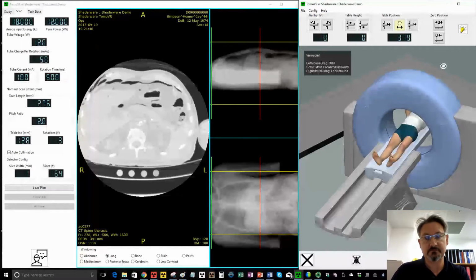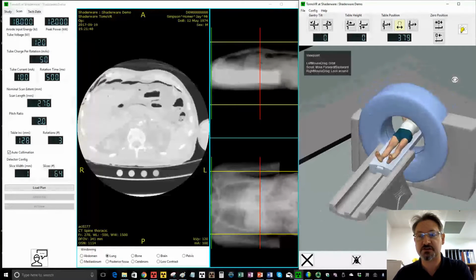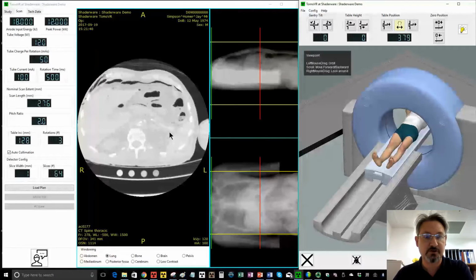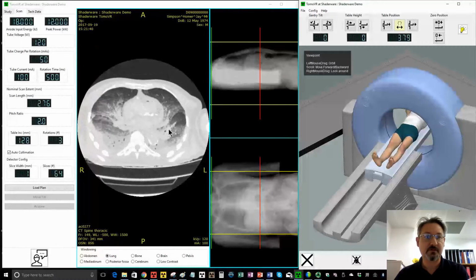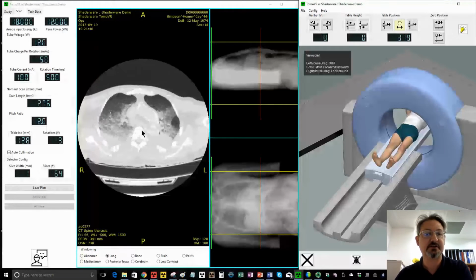So we would see this as a perfect demonstration tool to use in class to outline the steps and the procedures that you have to go through to position a patient for a CT scan, and talk about the terminology and to give an idea of the functions of various parameters that are required.